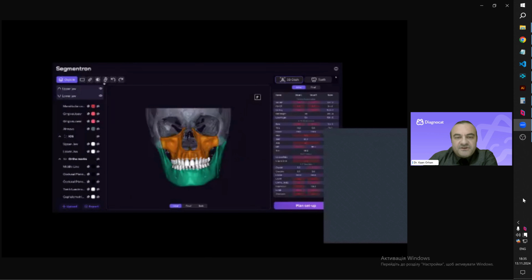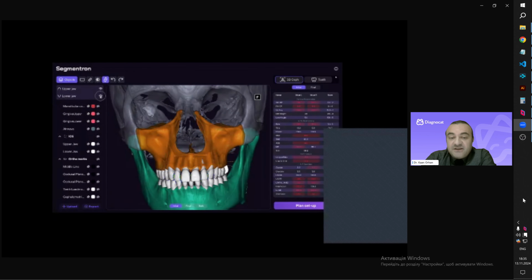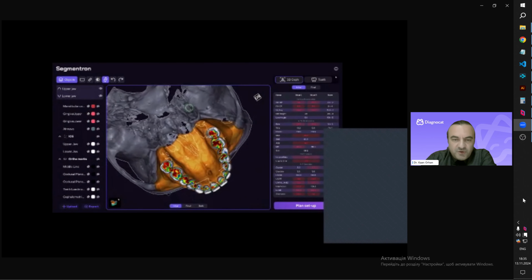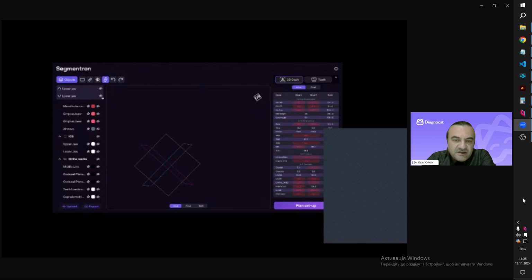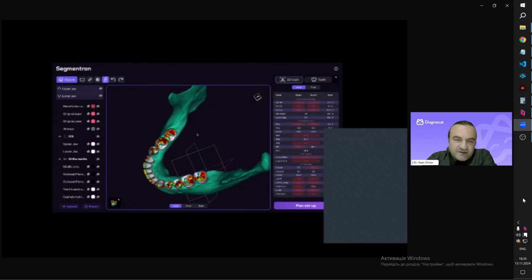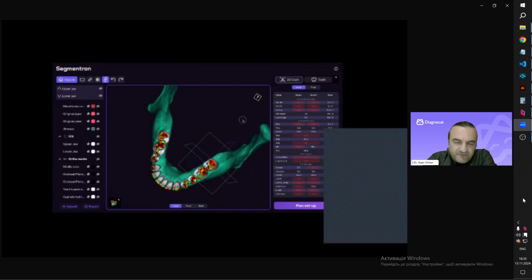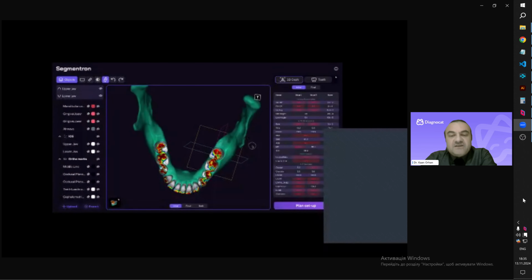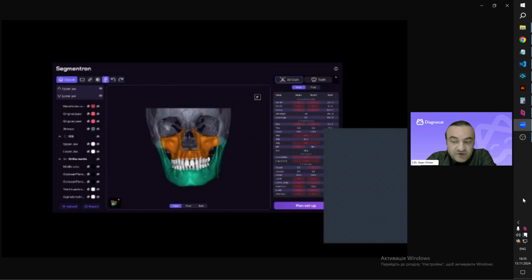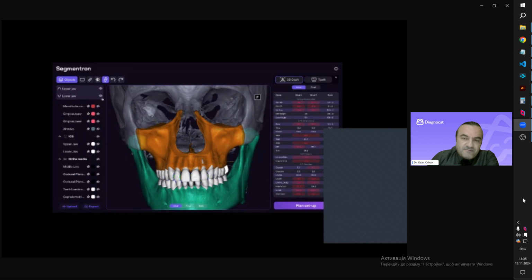So here is the initial phase, and we can compare the initial, the final, and both. And what we can compare, especially, is the occlusion as well. See, we disappeared the maxilla. Right now, we can see the occlusal points of the mandible as well. This also gives you another insight about the occlusion, not just for the orthodontics, but also prosthetic rehabilitation as well.